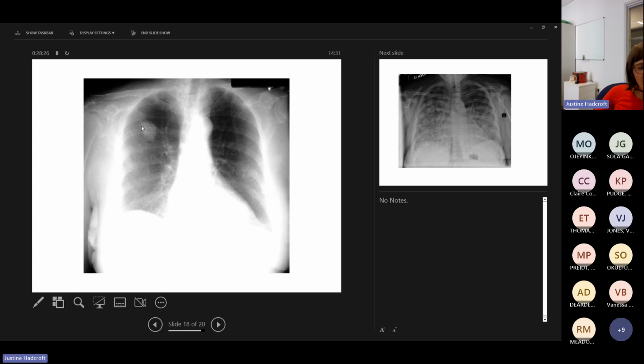And it doesn't look like it's an ECG sticker or anything external. It's relatively well demarcated, quite dense. I'd be worried that was a cancer. I suppose at the outside it could be a localized area of consolidation, but it's very round, it's quite dense, so I think this is probably a right upper lobe tumour.